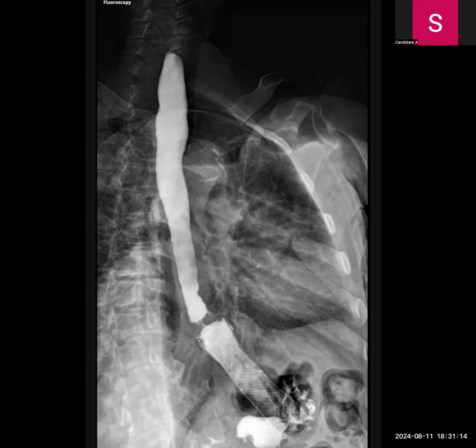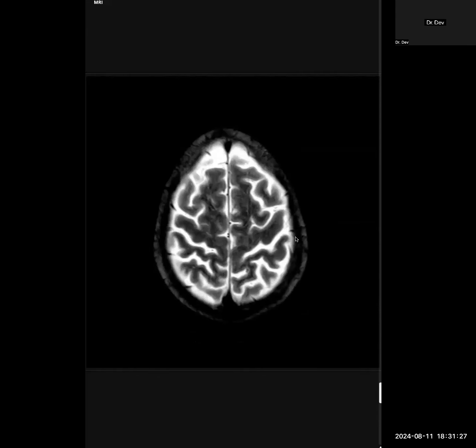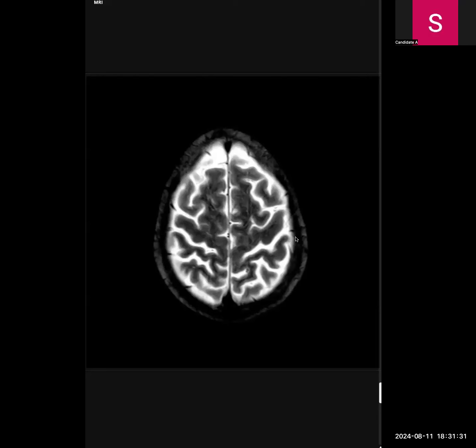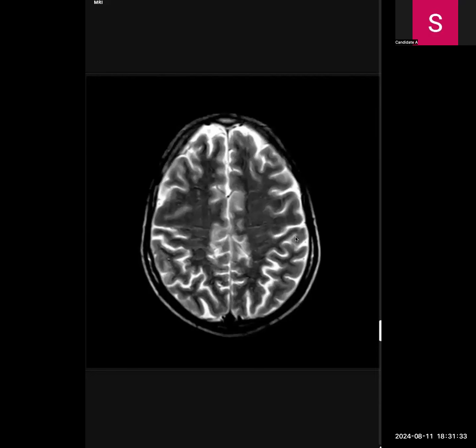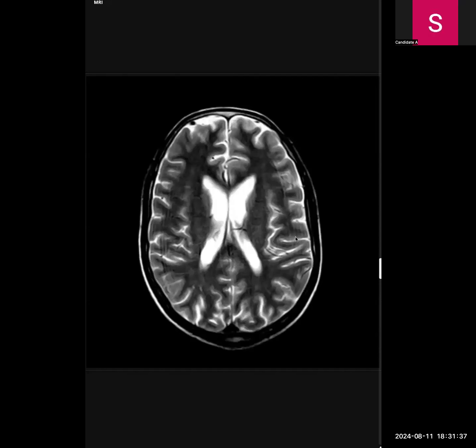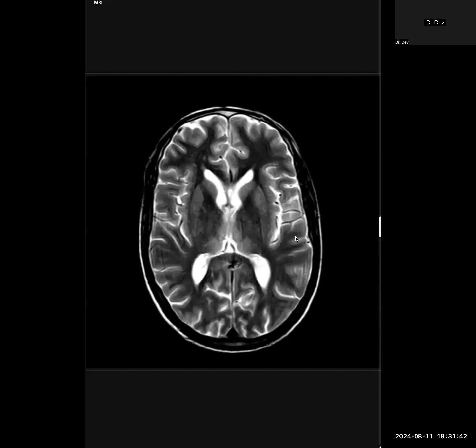So you ask for control and I'll give it to you. Go ahead. You have control. Okay. These are actual T2 weighted images of the brain. I'm just scrolling from cranial to caudal direction to see for any obvious abnormality. Just letting you know that you have 5 more minutes left.